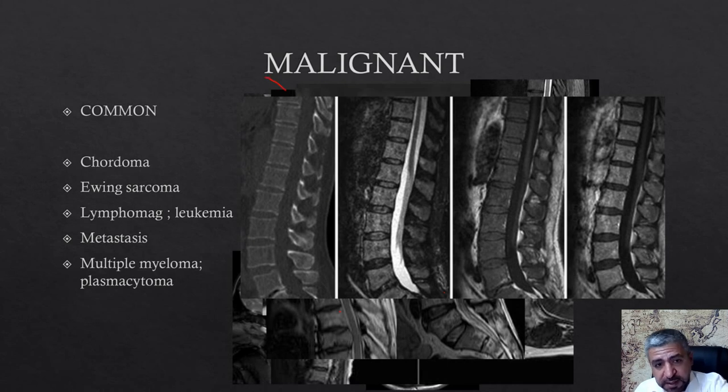Again, another example. What do you see here in this CT scan? You see that there is diffuse osteopenia. There is loss of the mineralization of the vertebra. Okay, and this is a feature of multiple myeloma. In the MRI, you don't see a distinct lesion, but these tiny dots here and there. Also in the T1, FATSAT and without FATSAT, this all includes the possibility of multiple myeloma.